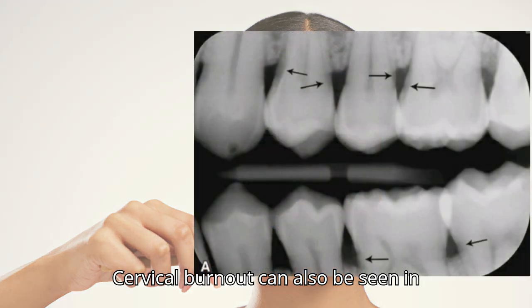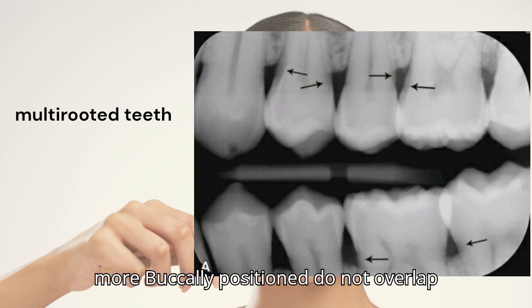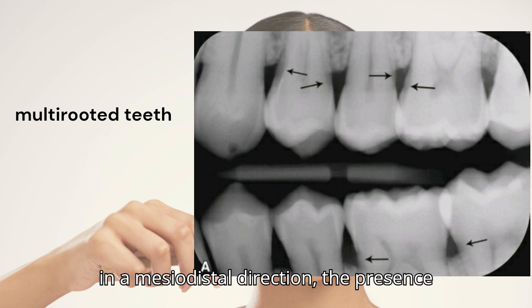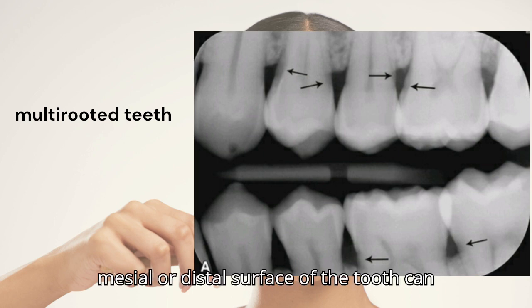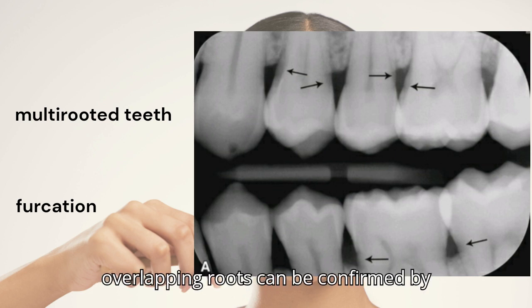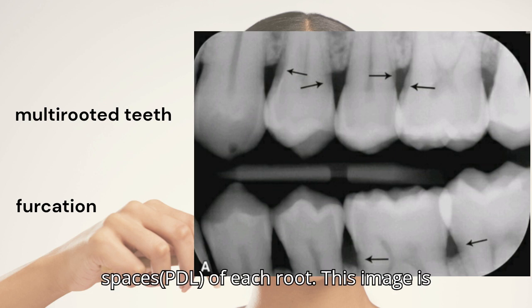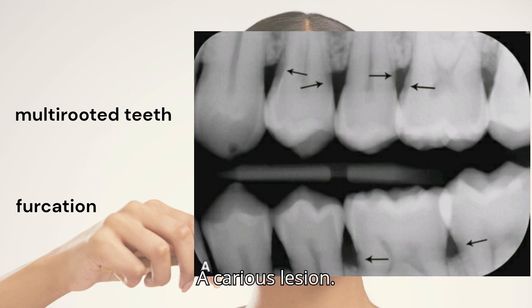Cervical burnout can also be seen in multi-rooted teeth when roots that are more buccally positioned do not overlap perfectly with a lingual or palatal root in a mesiodistal direction. The presence of a shallow furcation on either the mesial or distal surface of the tooth can make the area appear more radiolucent. However, the presence of two overlapping roots can be confirmed by identifying the periodontal ligament spaces of each root. This image is showing cervical burnout, which can mimic a carious lesion.